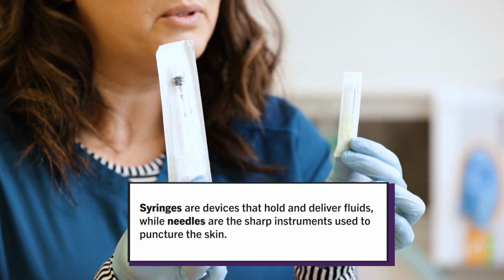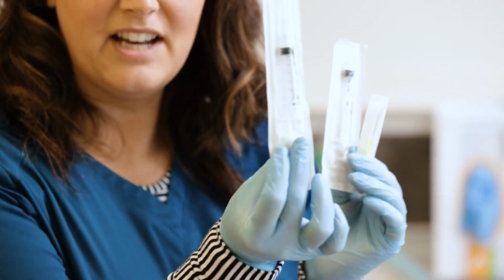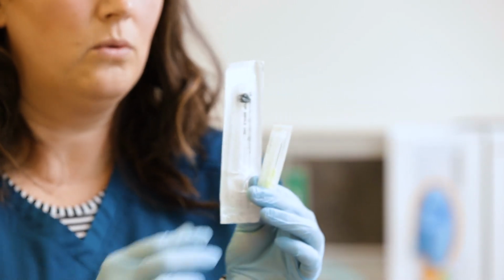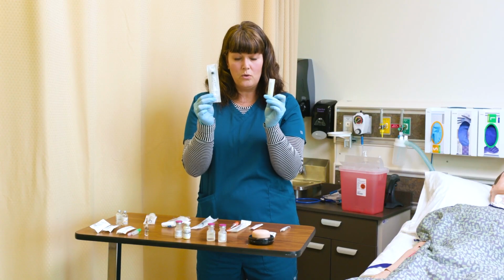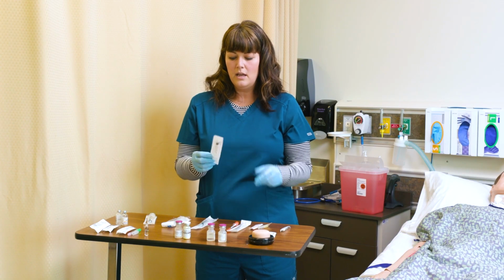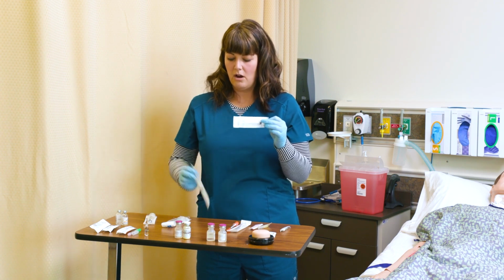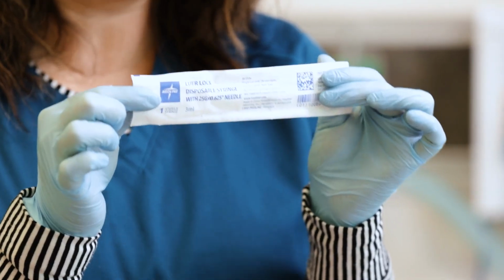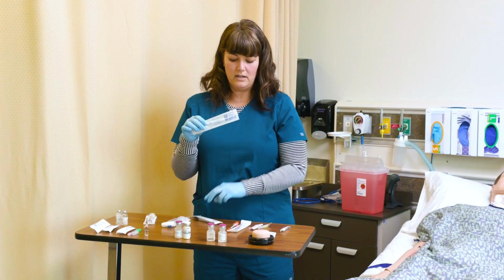Sometimes with your supplies, your syringe will come already attached to your needle, and sometimes separately you will have your syringe and need to select a needle. So pay attention when you are looking at your supplies. You are seeing what equipment is included in that supply, and you're also looking at what size needle is attached to that syringe. We're going to talk about different sizes of needles.